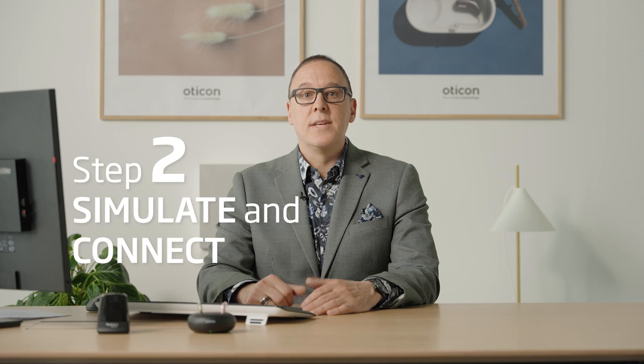Step 2 is simulate and connect. Now, when simulating, we have the option to explore options for hearing devices within the Oticon portfolio and decide, based on the child's hearing loss, which hearing aid is going to be the most appropriate one to choose. Now, when you are ready to go ahead and start programming your hearing aid, you're simply going to hit the Connect button.